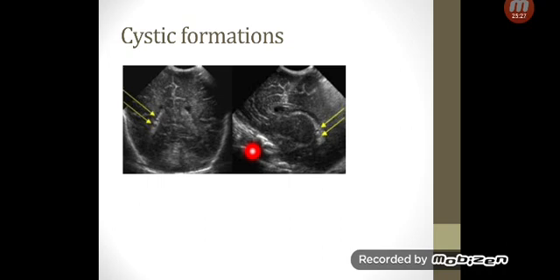There are normal cysts and abnormal cysts, and interpretation for cysts is usually different from other lesions because it depends on a lot of factors, like, are you looking for them? Are they incidental findings? Do they mean anything regarding abnormalities that you've got with the brain, your expectations, infections? So it always depends on the patient, really.